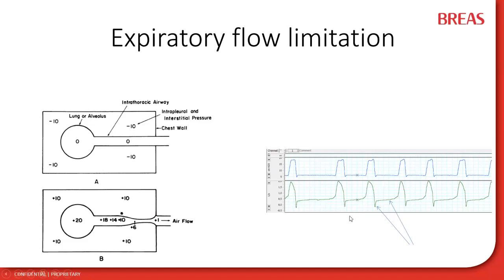And the change of trend, this point, is considered to correspond to the choke point in which the airway is collapsed. So when you see this kind of waveform, this highly suggests expiratory flow limitation.